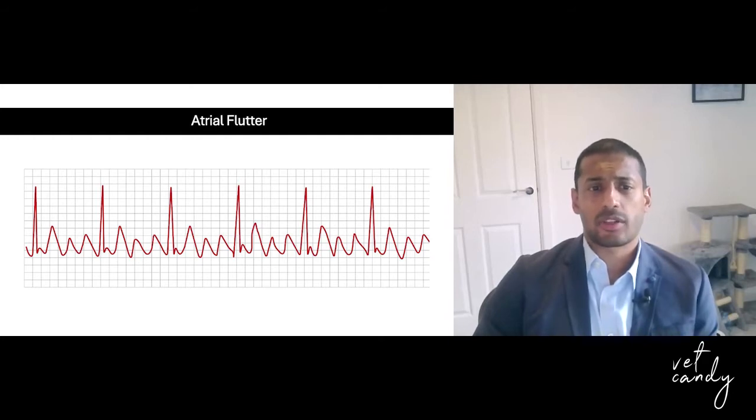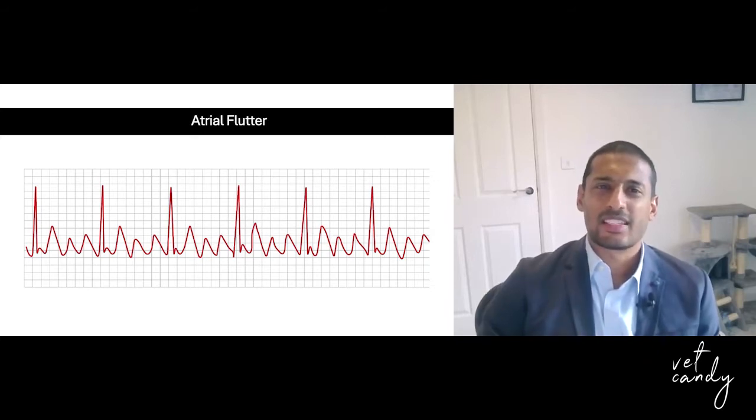As such, the atrial activity on the ECG is more uniform. However, you still don't have normal sinus P waves. Instead, the typical appearance is this uniform sawtooth flutter wave appearance. Again, just as in atrial fibrillation, the QRS complexes should be tall and narrow.